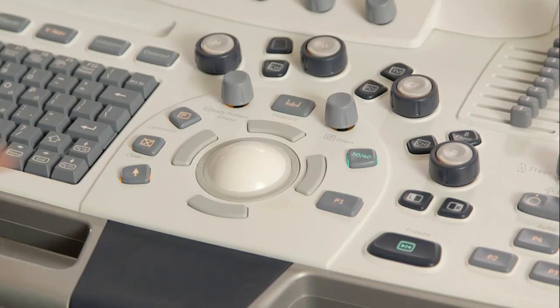Press the print to save this data. You can manipulate this data at any time, even after the patient has left the exam room. If you would like to render the anatomy, go back to the Static 3D tab and select Render from the visualization drop-down.